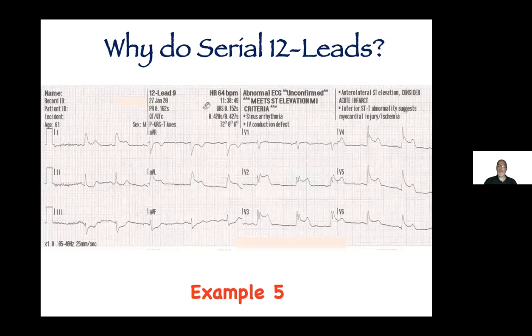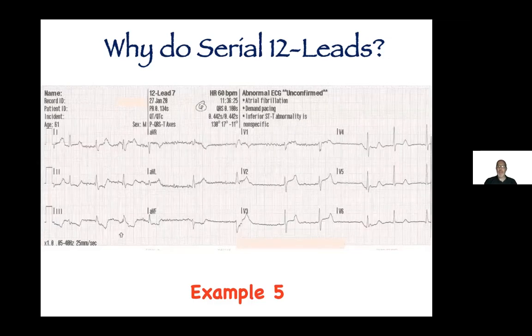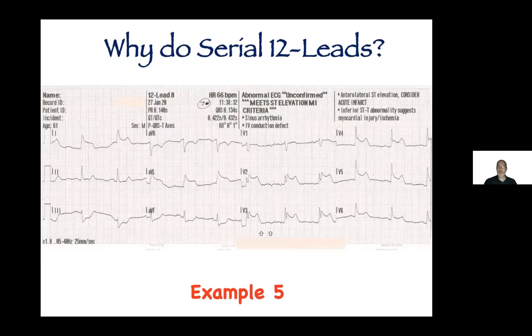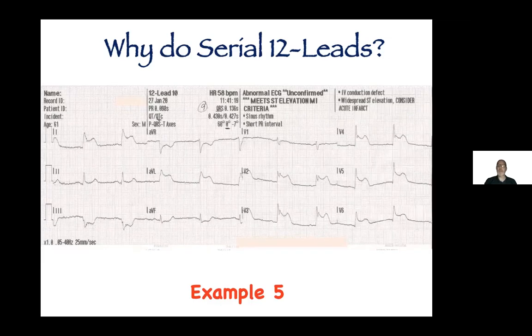So this man went from a seemingly normal EKG, and all of these were in the field. The difference between this EKG, this was 11:36, and this one is 2 minutes. So in a matter of 2 minutes, the patient deteriorated to this, and then ultimately to this. And this was an extensive infarct. And unfortunately, the man did not have a good outcome. He did not leave the cardiac cath lab alive.